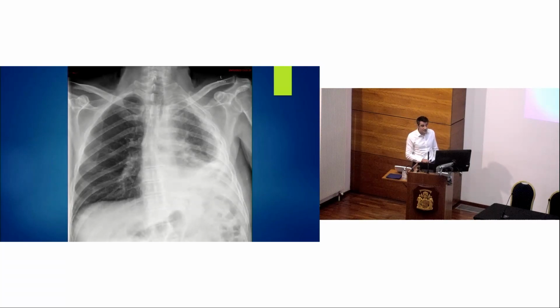What else might we see? Well, the next two slides are going to show you the classic appearances of mesothelioma on a chest X-ray. Now, these are clearly advanced cases, but what we can see here is the mesothelioma tends to encase the lung, and see this side's smaller than this right side, which is normal. And here we've got a rind of opacity, this white stuff, circumferentially around the lung, and that's tumour encasing that left lung and causing it to contract.